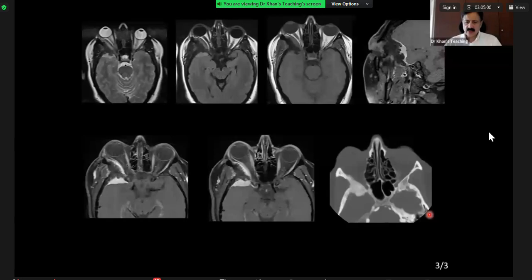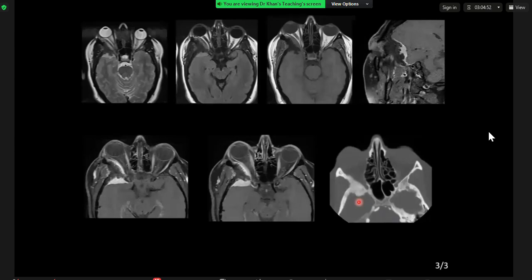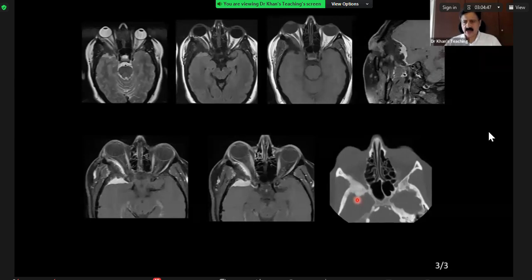Right. Now, the point is that this is a very, very important exam concept, and this is why I wanted to show you. Though the territory is more head and neck than classical brain, please remember that this is a very important exam film where they will show you a skull X-ray, a plain X-ray, where there might be focal sclerosis of part of the skull. Now, focal sclerosis, one of the differentials for that is a meningioma.